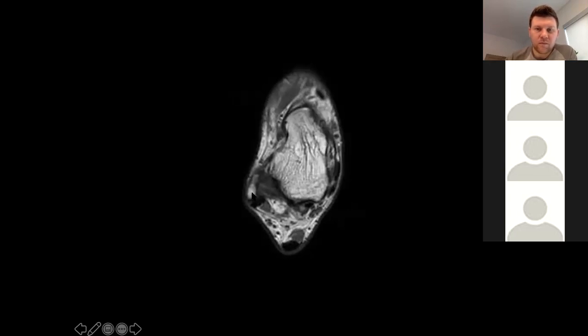Your lateral malleolus. Good. So the tip of your fibula is right here. And what did we just mention before that you can see, this nice thin black line here? The retinaculum. Good. So if you see this ruptured or you see the peroneal tendons out, what do we call that? Peroneal subluxation. Okay, good. So that's what you'd be looking at for that.